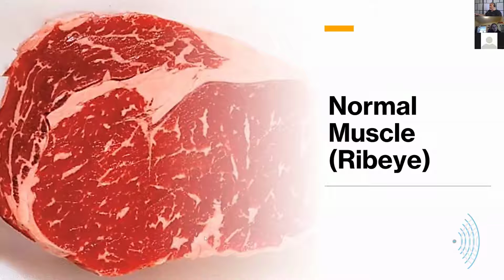We have also areas within the steak slice that is an intermuscular aponeurosis that come together as we get closer to the insertion to form a tendon. But visually, as you take a look at ultrasound images and you see muscle structures, this is exactly how it's going to look. And so I'm going to show you this as the normal muscle.